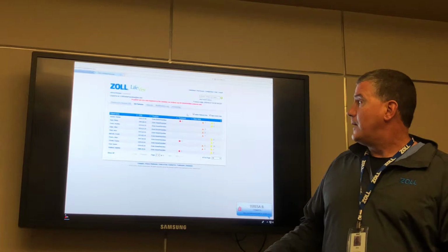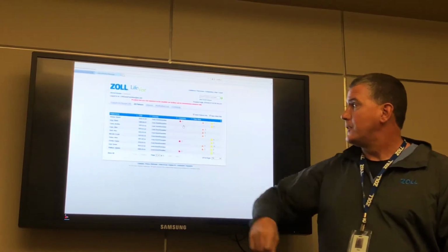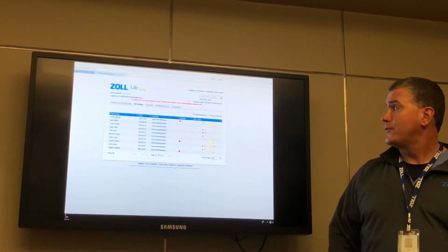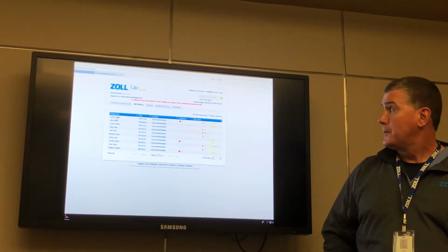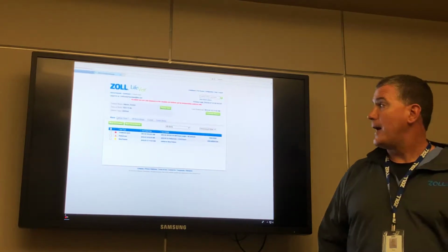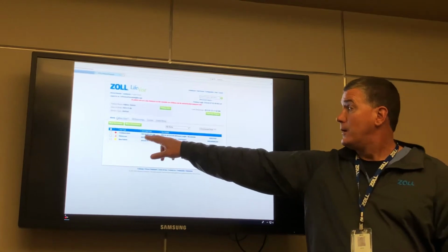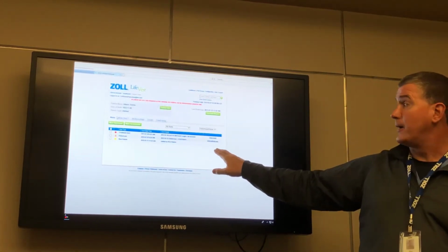Let's look at the first patient there, Adams. You want to look at his treatment or just his? Yeah, let's just take a look. No, just click on the name real quick. All right, so when we click on Mr. Adams, we get to the alert page here. We know that he's had an alert, he's got a treatment, so we can look at those events. We're not going to do that right now.